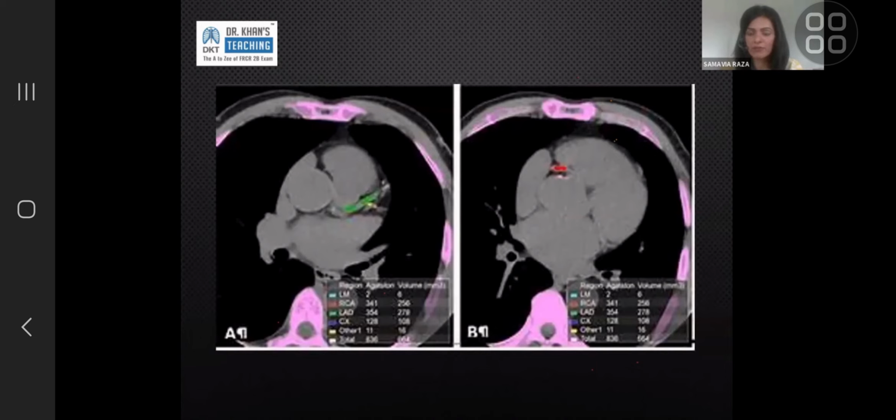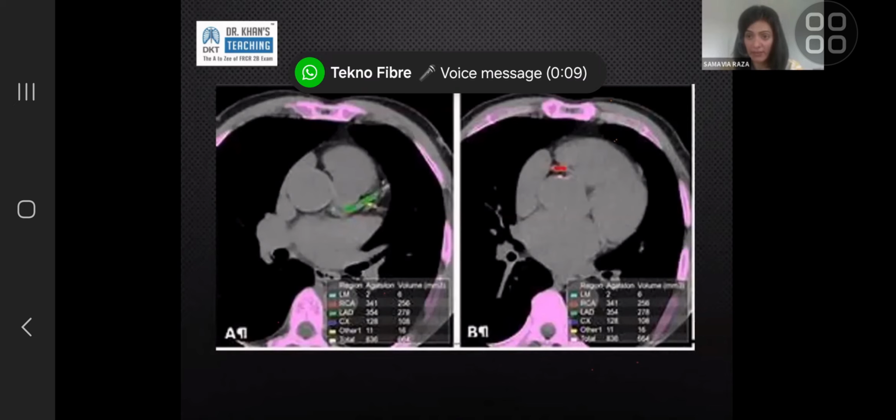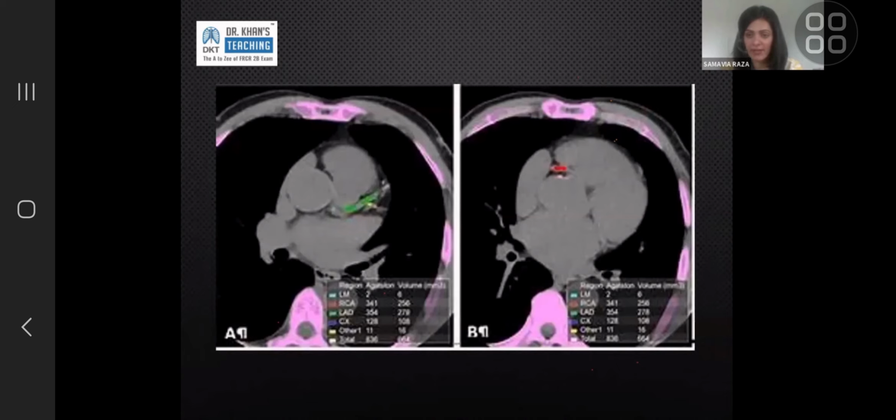The degree of stenosis is measured on cross-sectional diameter. It is not measured by eyeballing it. It is not measured by looking at the vessel in that view. You have to look at the vessel in a cross-section, and you have to look at it in terms of diameter, not area. So that's really worth remembering. Diameter stenosis on the cross-section of the vessel is the value you use to call it mild, moderate, severe, etc. What we call significant stenosis is actually anything over 50. So moderate and severe are all significant stenosis. Then it comes into near occlusion and occlusion.